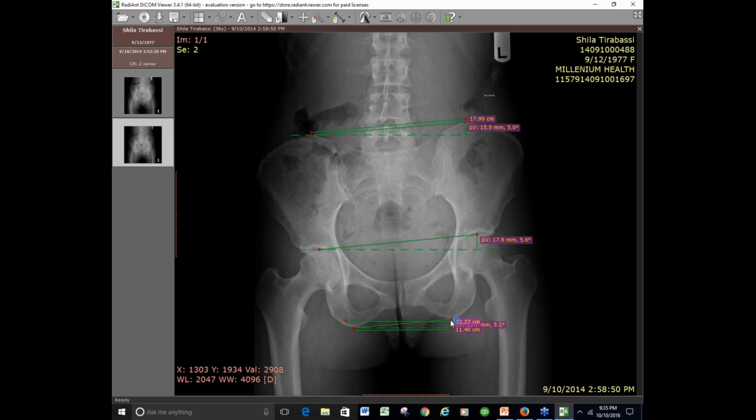Because we have goniometers, that might be even the easier way to do it. And then what you're going to have to do is figure out, okay, what's the ratio between this one and this one? And it's, let's see, my C squared was 12. And so you're going to put 17 over 12. You know what? Let me put that together because it's going to get complicated. But there is a formula, and I'll put 18. Let's see, 18 over 12 will give me the ratio of my C squared. You might have to take a square root.